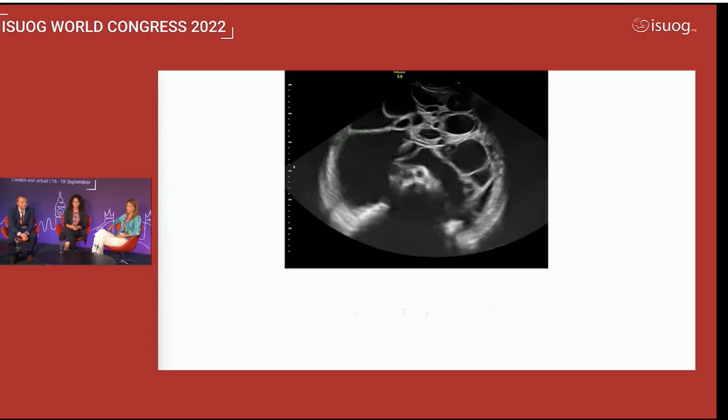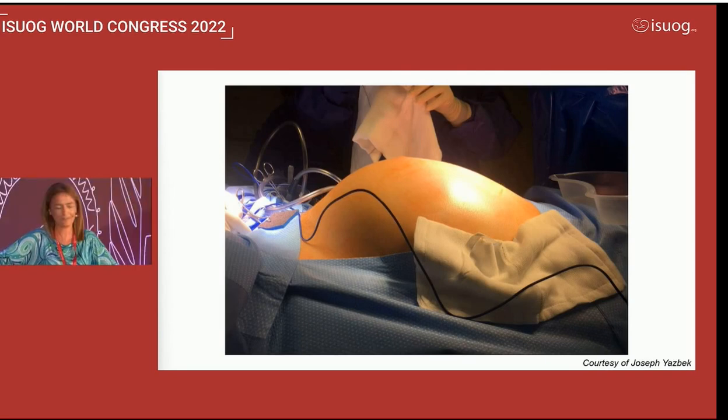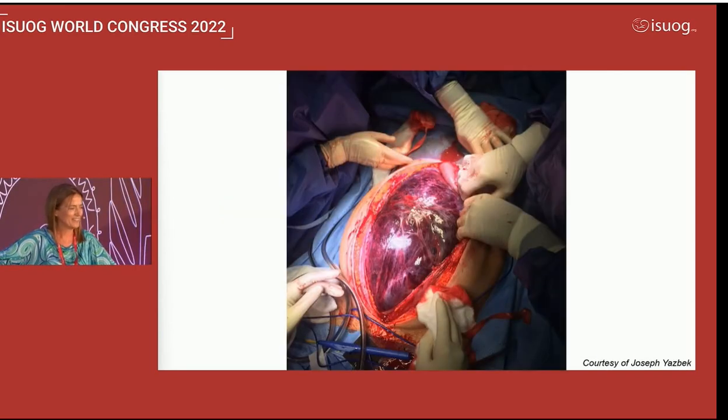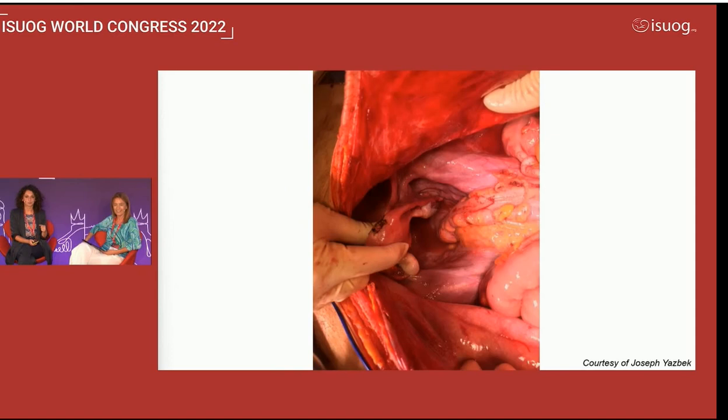She underwent surgery, and it was a leiomyoma with cystic degeneration due to a torsion. This was a case also seen together with Mr. Jasbeck. Very useful to confound the idea. I know, but this is real life, and I wanted to share these pictures taken by Mr. Jasbeck because it was very typical.